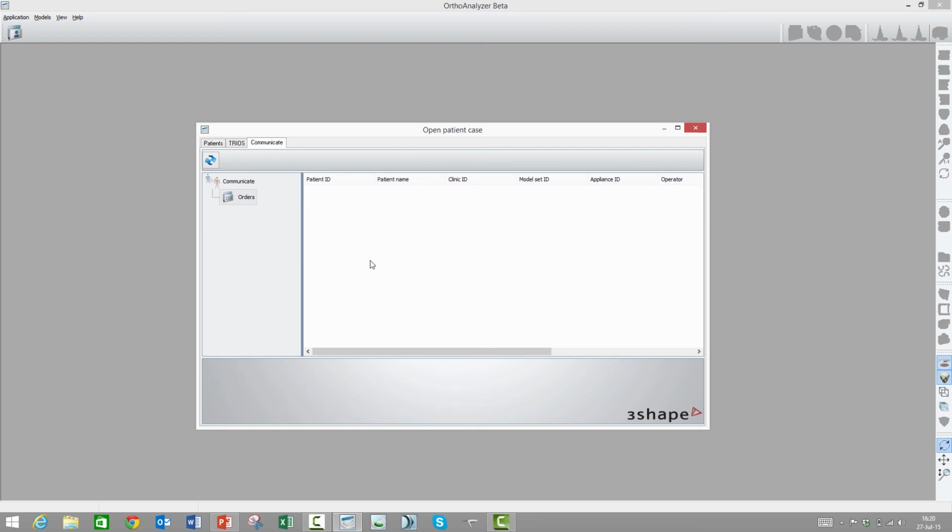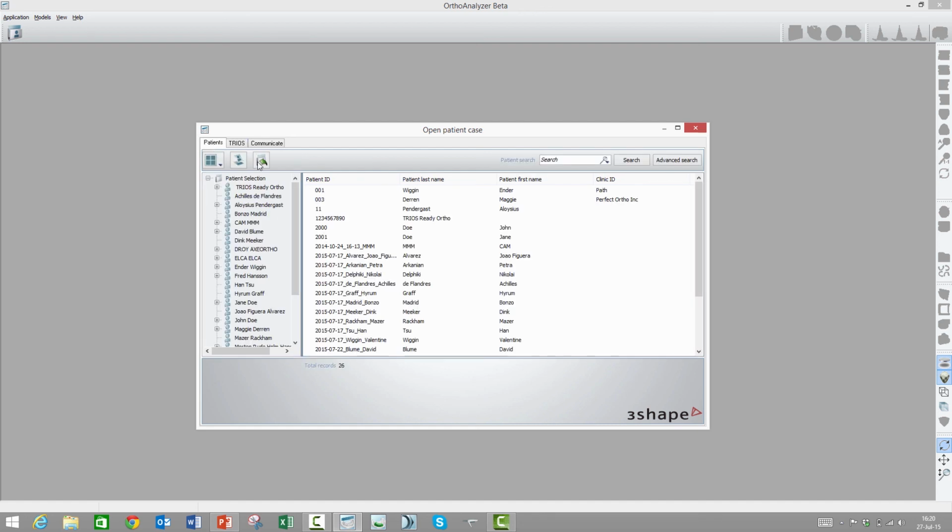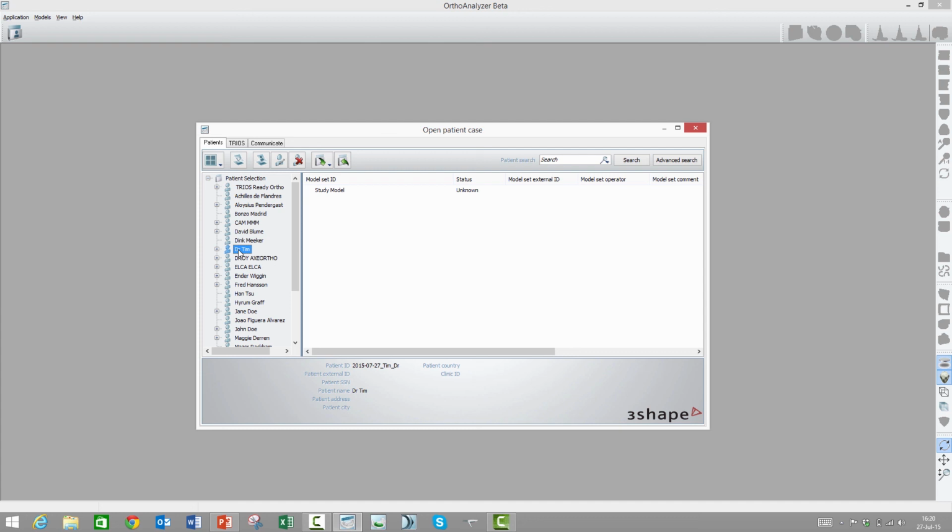So now this order has left my Communicate tab and it has gone into the patient browser. When I go to the patient tab here and click search again to do a refresh, I'll actually see there's a new patient called Dr. Tim here. And that's it.